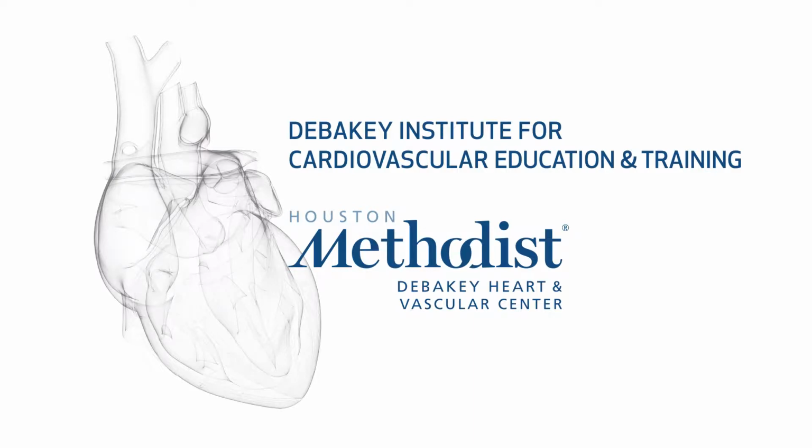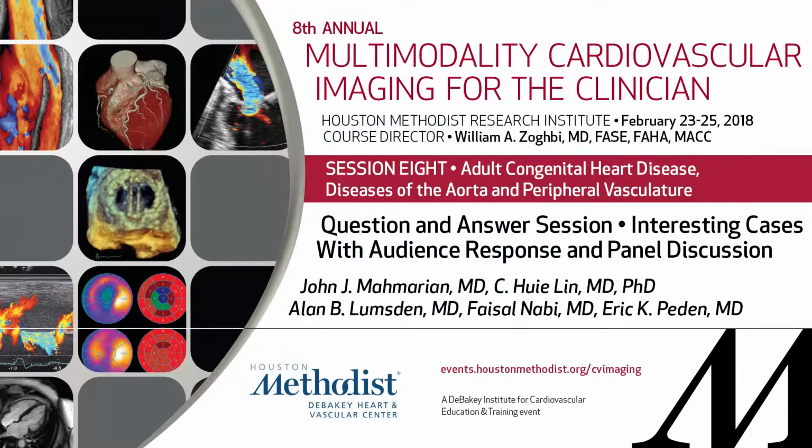I'm going to spend the next 15 minutes or so going over some cases. These are just some cases from the lab. They're going to be CT based, looking at different types of abnormalities. And I'm glad we have Dr. Nabi up here because he can also help in terms of looking at this.